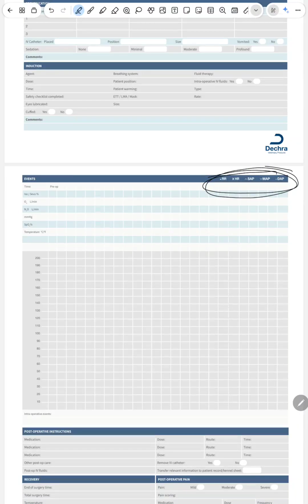My pen is failing. There we go. And figure out where are my symbols. Okay? And then you're going to look elsewhere for the other part of symbols, because you can see over here where my symbols are, it doesn't say anything about SpO2, doesn't say anything about end tidal, it doesn't say anything about assisted ventilation or spontaneous ventilation, if you're going to have a differentiation of symbols for those types of things. Okay? So ISO and SEVO, you're going to circle, I'm sure, which one you're using. I like to cross out the other one, put my initials next to it, just so there's no confusion.